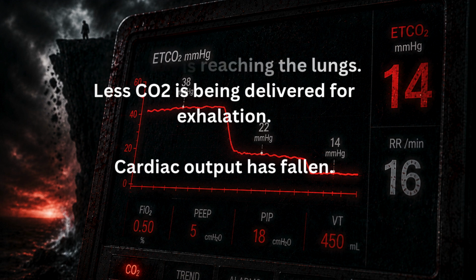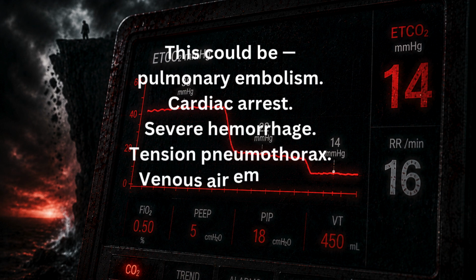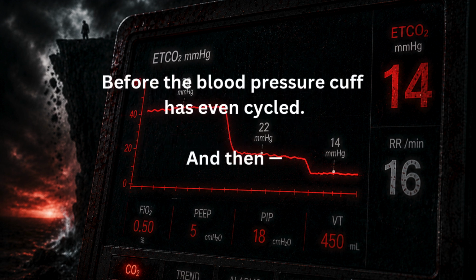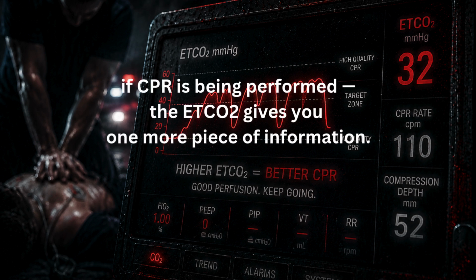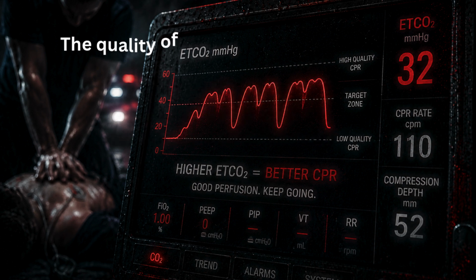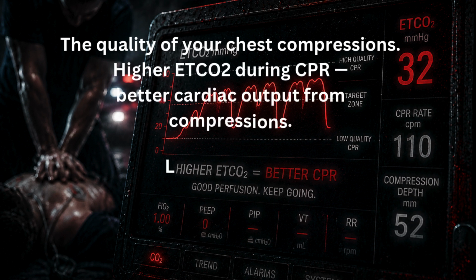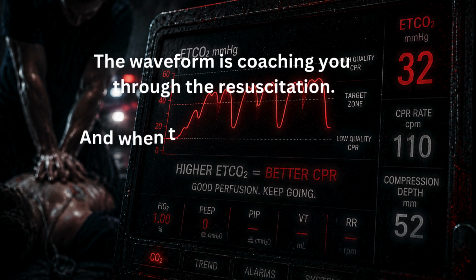Cardiac output has fallen. This could be pulmonary embolism, cardiac arrest, severe hemorrhage, tension pneumothorax, venous air embolism. The capnography waveform just told you that the circulation is in crisis, before the blood pressure cuff has even cycled. And then, if CPR is being performed, the ETCO₂ gives you one more piece of information: the quality of your chest compressions. Higher ETCO₂ during CPR, better cardiac output from compressions. Lower ETCO₂, compress harder, faster, deeper. The waveform is coaching you through the resuscitation.